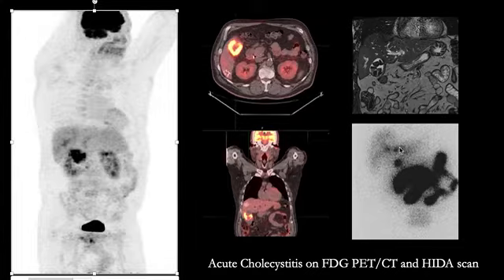and we have a delayed post-morphine image on the bottom right from the HIDA scan showing that the liver has excreted the tracer into the small bowel, and there is a small focus of activity which is at the hepatic hilum, and this activity is in the proximal aspect of the cystic duct, and the activity never gets into the rest of the gallbladder, which should be right here when we look at the HIDA scan and also the corresponding MR and the CT from the PET-CT.